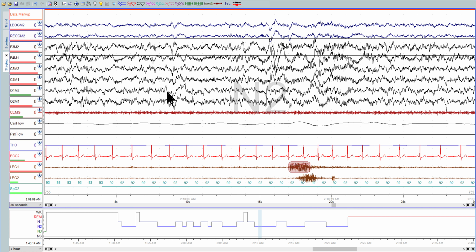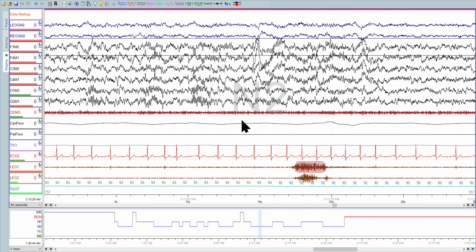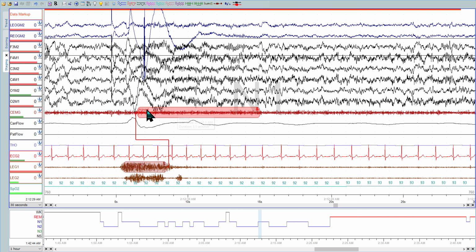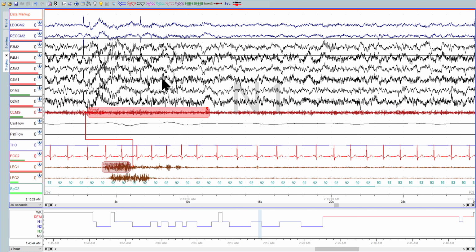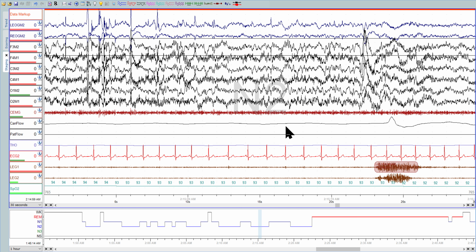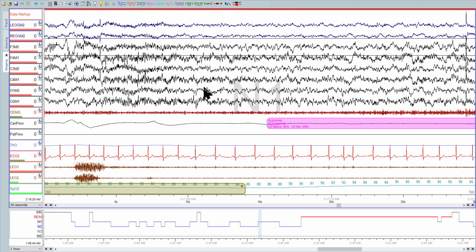Good. A little missed arousal right there. Good. And 1, good. 2, good. 2, good. Could be an arousal there. That's kind of arguable, though. I don't really think so. 2, 1.